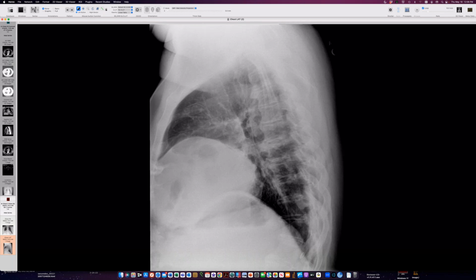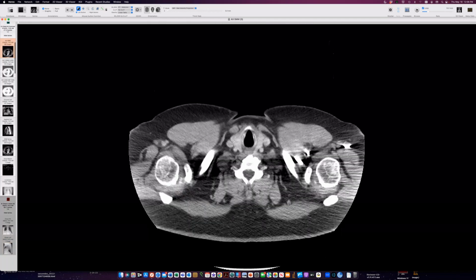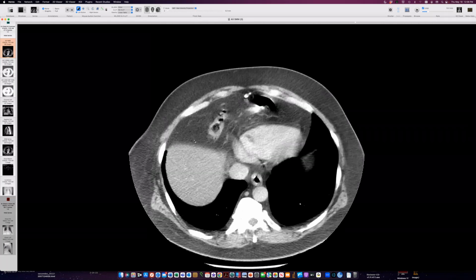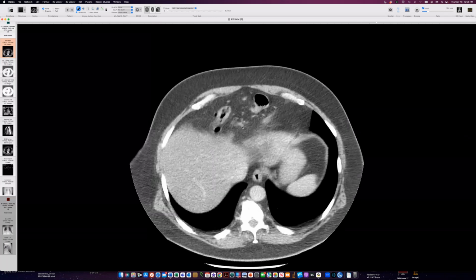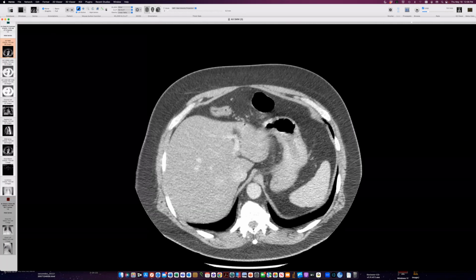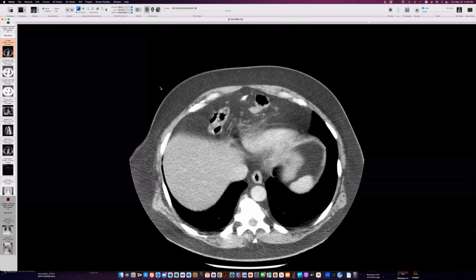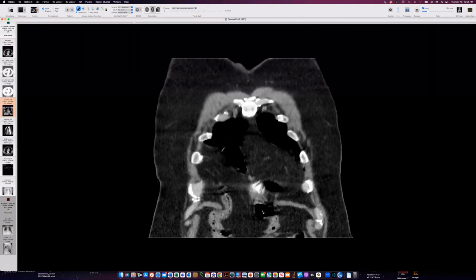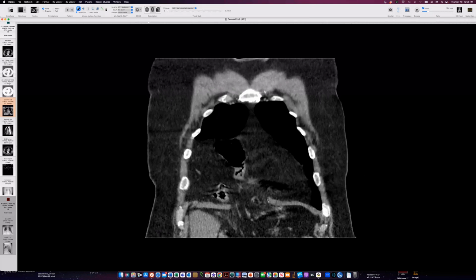So let's check it out on cross-sectional imaging here. And indeed, there's a whole lot of fat. And then we can follow the streaming of the vessels here to this anterior location. These things are particularly well demonstrated in coronal projection here because you can see the gap in the medial diaphragm on both sides. It's fairly well centered, just slightly to the right of midline, but it's often very close to the midline here.